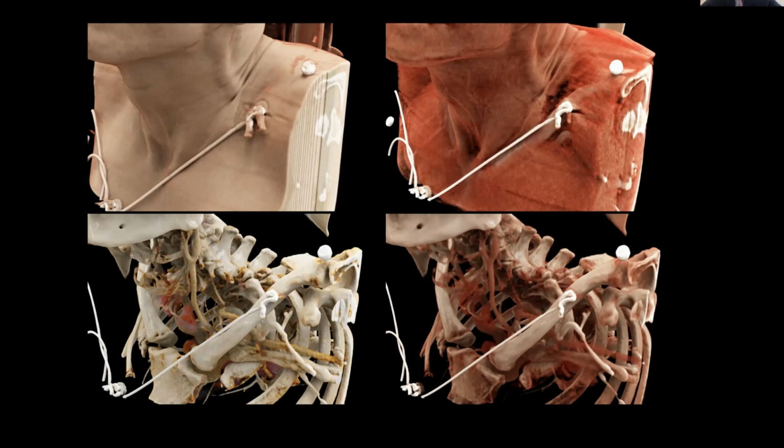which includes considerations of where the light is being directed from, how much of a shot. I don't know if you guys do much photography or film or anything like that, but depending on directionality of light, depending on things like shuttering, depending on a number of parameters, you can actually depict these structures in various ways, which is what allows us to visualize the layers that we see. It also is what allows us to visualize the different depths and the shadowing of structures on top of one another.